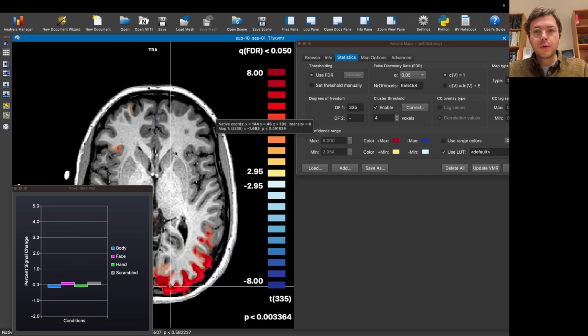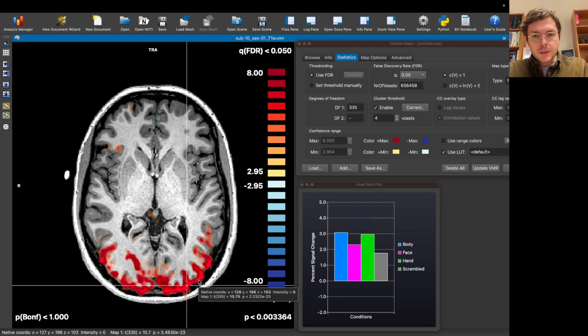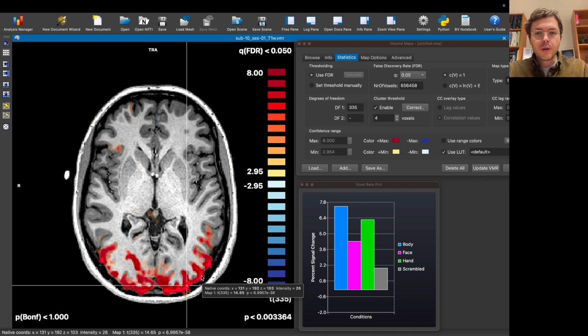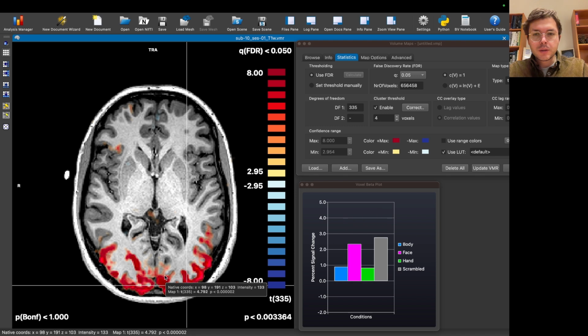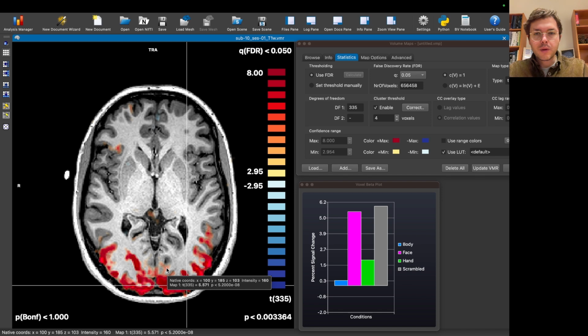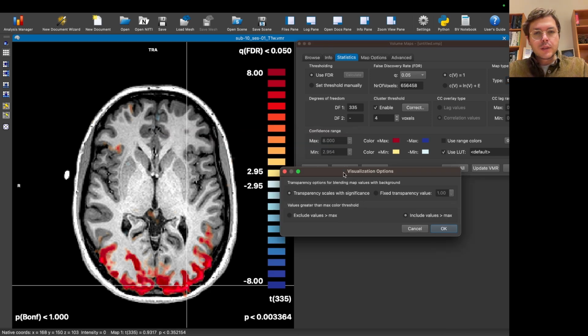And let's have a look at it maybe in a bit more zoomed view. So we can see that these very bright spots, and you can have a look at this p-value that's written on the screen right next to the cursor. That p-value is very, very small, or very, very close to zero, let's say. Whereas in a less red region, let's say a bit more transparent region, that p-value is higher, as you see. Okay, so this is how we scale the result with the significance.